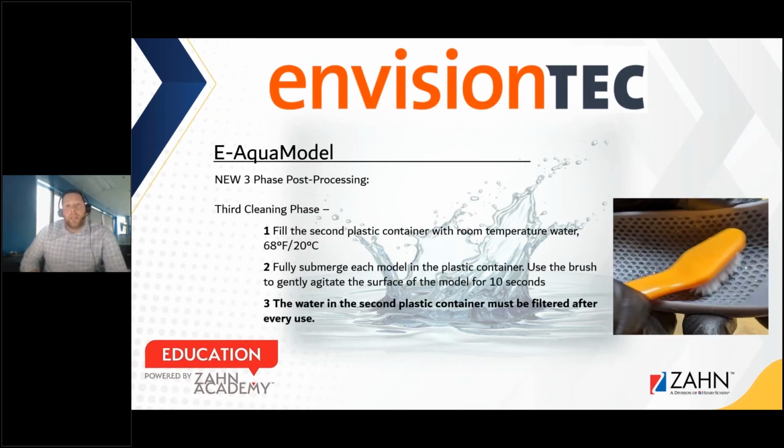After the models have been run through the ultrasonic, we take the units back into a second plastic container at room temperature, so we don't have the same contamination that we had with the first bath. You fully submerge each model and lightly brush it to ensure any uncured resins are fully removed from the surface and are fully soluble in that water. So we've gone through the first part, the second part, and the third part.